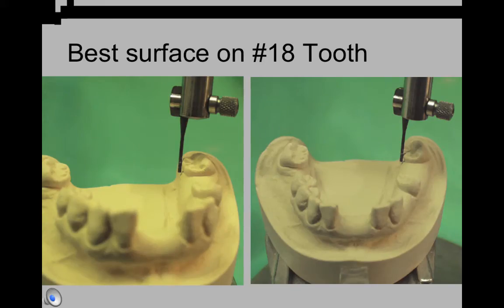Here you can see the two undercuts on the lingual of the molar. It appears that the undercut is pretty equal on the mesiolingual and on the distolingual. Therefore, on number 18, you would not have to modify the tooth on the mesiolingual any more than on the distolingual in order to place the first 2/3 of the direct retainer above the survey line. So you can place the simplest circumferential clasp, which has the direct retainer going from the mesial to the distal. You do not have to do more modification on the tooth whether you come from the mesial or from the distal.